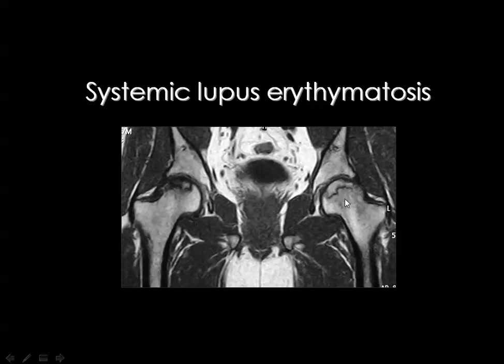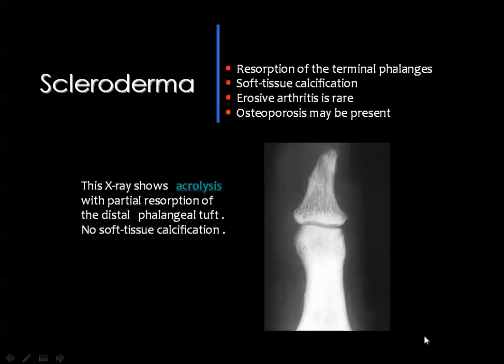If the dead bone is of similar signal intensity to the normal bone, this means an early stage of avascular necrosis. But if this dead bone has transformed into fluid signal, you are dealing with a more advanced disease. And if it is in the form of bone sclerosis, you have the severest type of the disease.